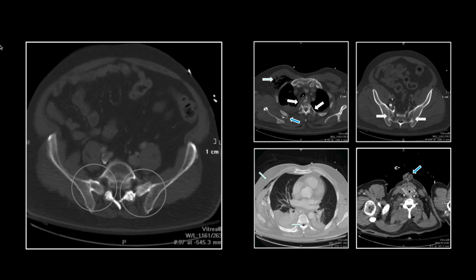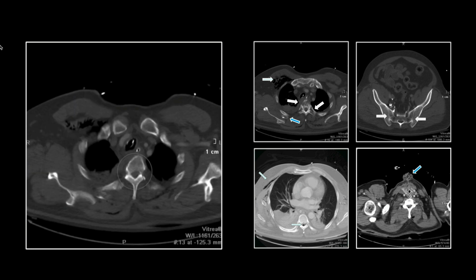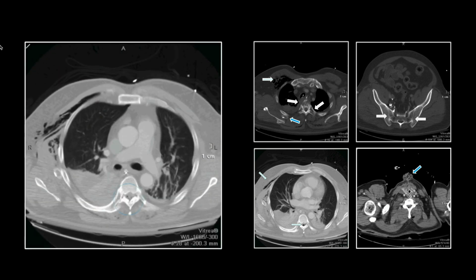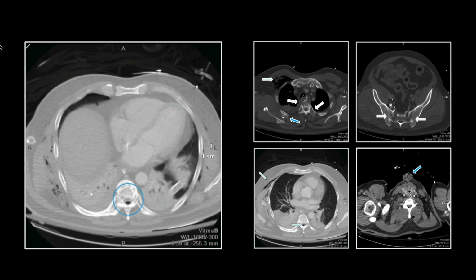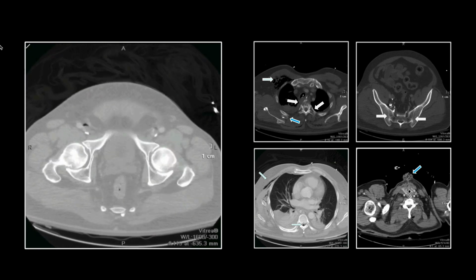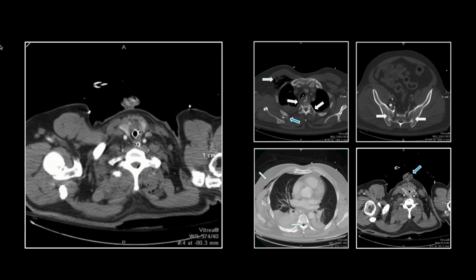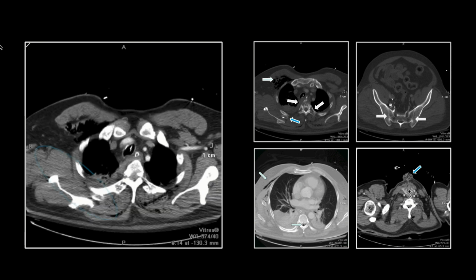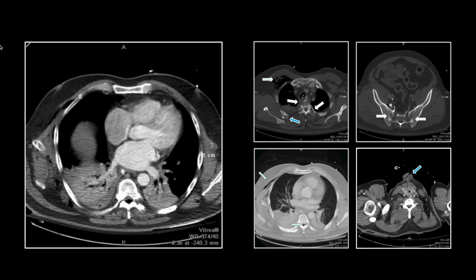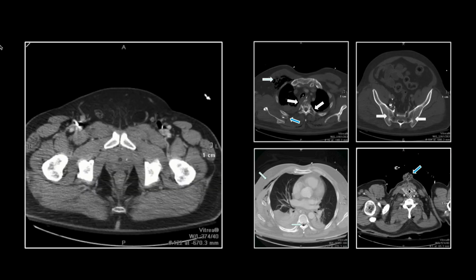And then let's get a cine view of those fused ankylosing spondylitis sacroiliac joints. Next on the lung windows, you can see that epidural gas collection. Not a typical finding. And then lastly, that cricothyrotomy incision and the inappropriate placement of an extrathoracic chest tube and an intraparenchymal chest tube on the right and left.